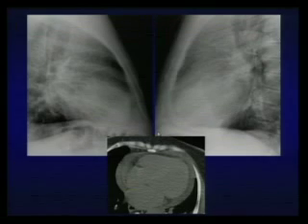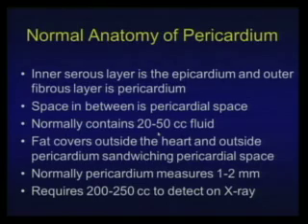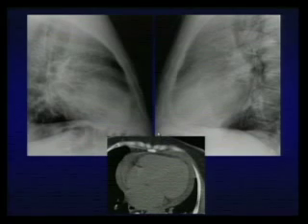And this is the CT of another patient with pericardial effusion. If you see here, you can delimitate the myocardium. This is the myocardium, that is the portion of the heart. Outside this myocardium, you have a fat tissue that is epicardial fat tissue. Then you have a linear opacity that is the pericardial sac that is measuring up to 2 millimeters. And outer to that, you have another fat tissue that is the pericardial fat tissue or fat tissue in the mediastinum.